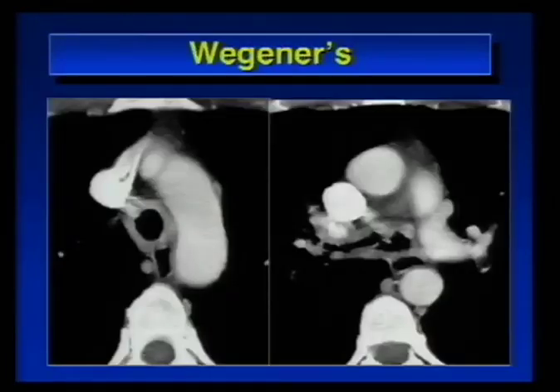Okay, so what are we seeing here? Well, look at the trachea. There is thickening of the wall, and down here in the proximal bronchi is irregularity of the airway wall. Look how irregular it is. That's characteristic of Wegener's, to have irregularity of the wall. It typically is short segment, but it can be long segment. But if you see irregularity and thickening, differential diagnosis is Wegener's, amyloid, sarcoid, and infections such as TB or histoplasmosis. Those are the things that cause irregularity of the trachea.